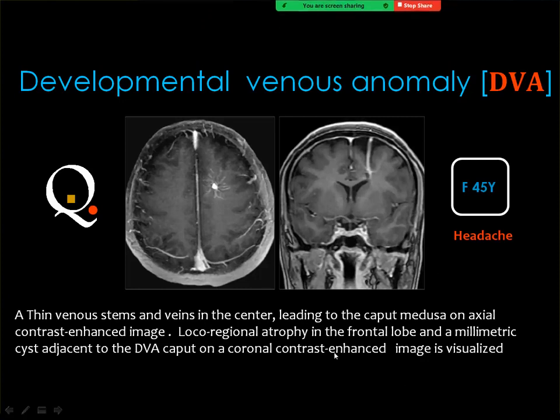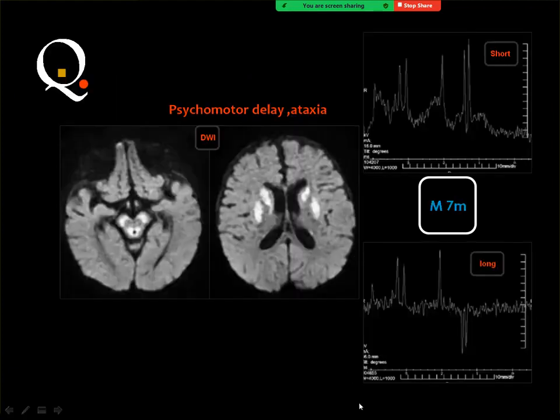and should not be diagnosed as arteriovenous malformation, because if you surgically remove this lesion, or if you try to embolize, you will damage the normal brain and you got an infarction. This is a normal variant.